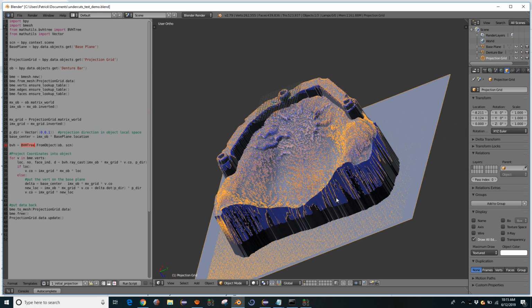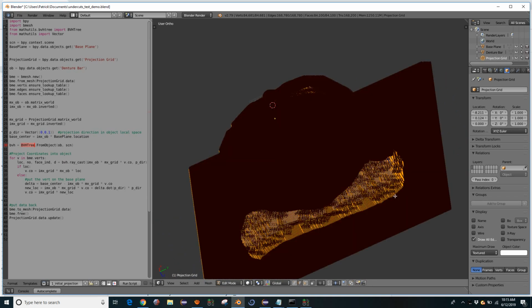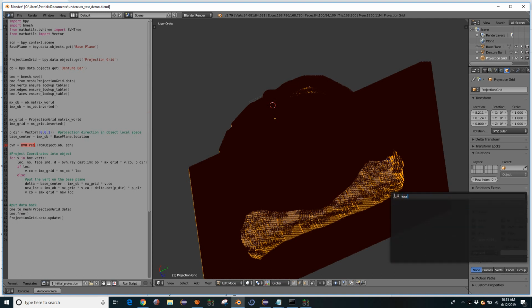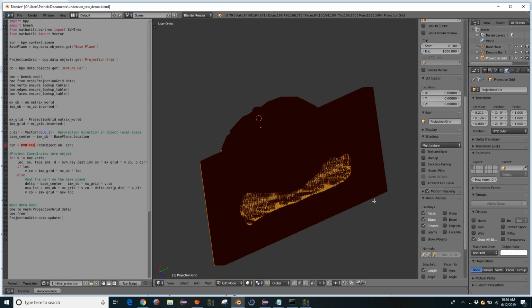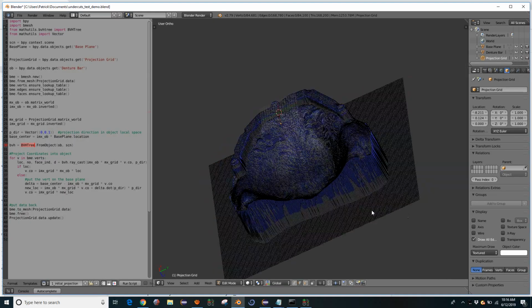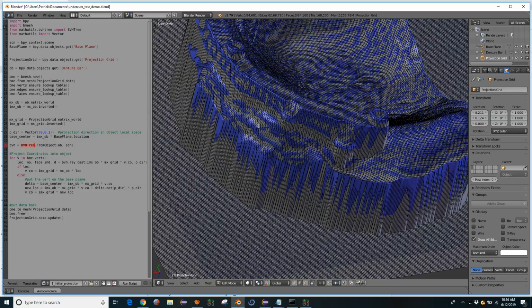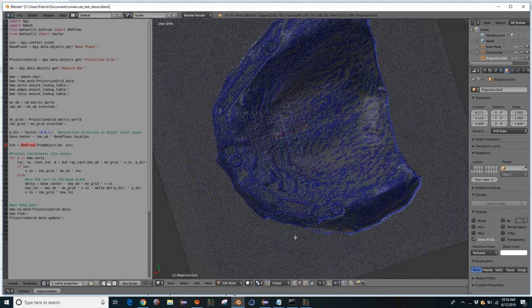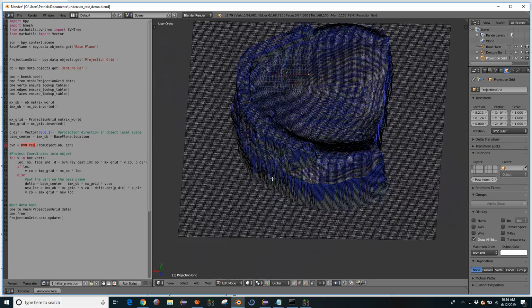Okay, so this is nice in that, let's see here, I need to flip the normals here, and let's turn off the edge length. This is nice because when we're projecting a predefined topology, your grid can never not become a grid.